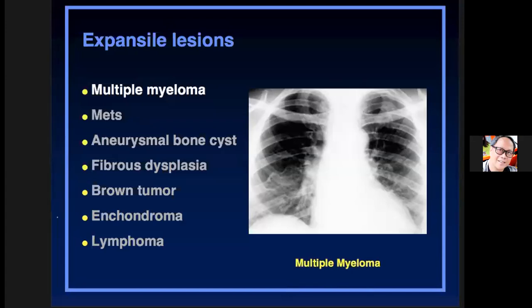Well, not really the costochondral, but these are posterior ribs. So again, you have to differentiate anterior from posterior ribs. The posterior ribs are more cephalad, and if you follow this rib, the posterior rib is higher, then it turns at an angle, then the anterior part is lower. So the lesion here is in the posterior rib, in this particular area. If you do rib counting, 1, 2, 3, 4, 5, 6, probably the seventh posterior rib. It's multiple myeloma in this case.